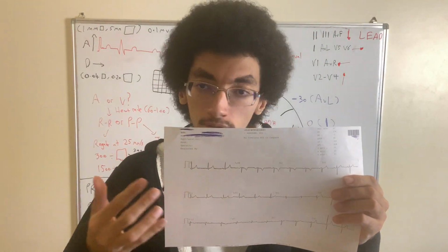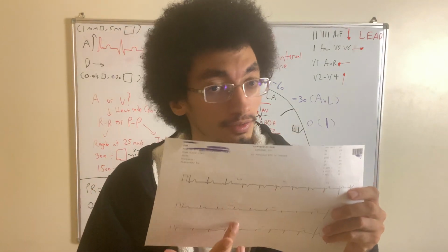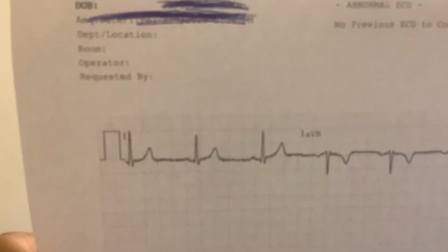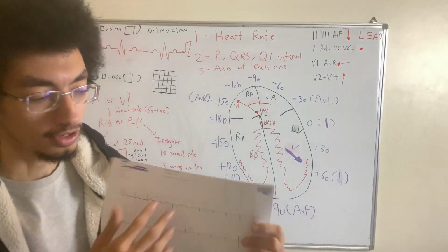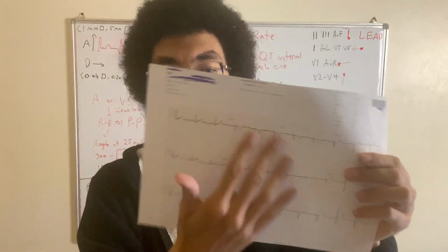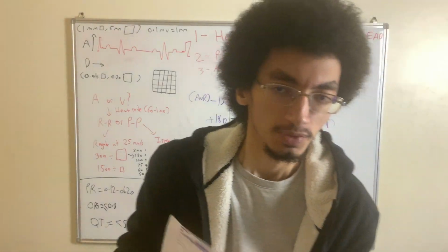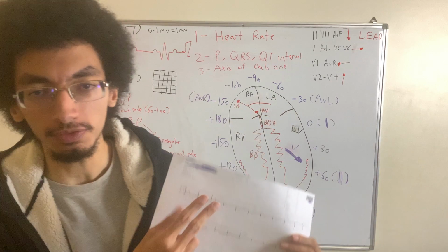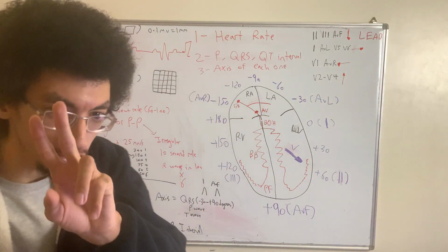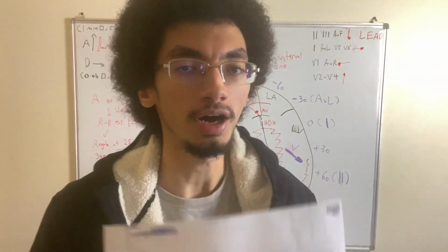Lead 1, lead 2, lead 3. You have aVR, aVL, aVF, V1, V2, V3, V4, V5, as well as V6. They're organized tightly. And if you notice, not all of them finish all the way. For example, in lead 1, you will see it briefly, for like 2 sinus beats, which means this one and this one. Then it stops, and then it will show you aVR.